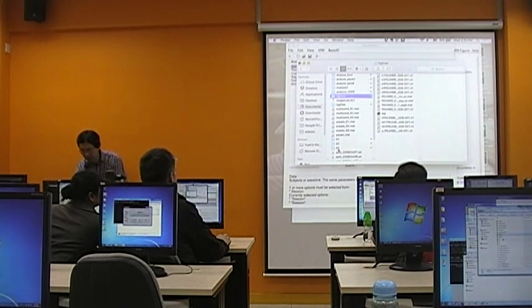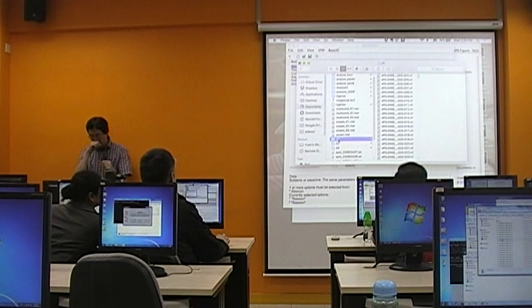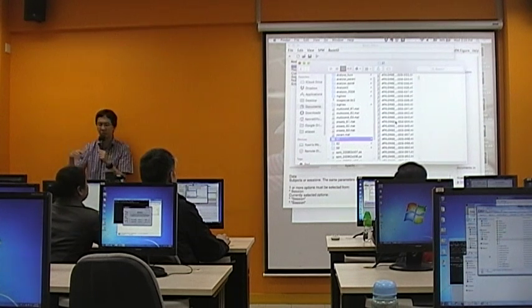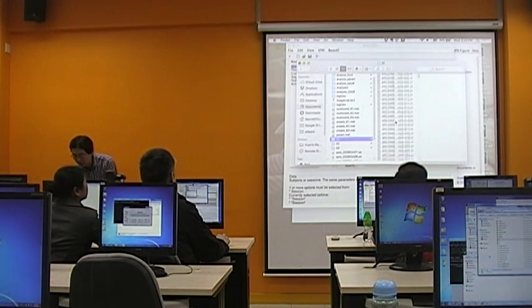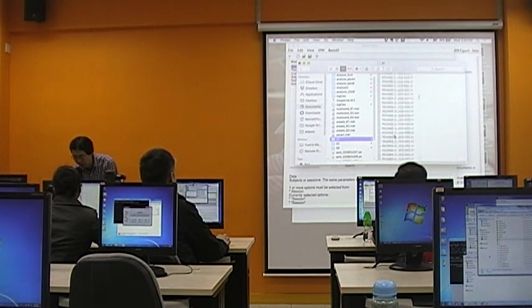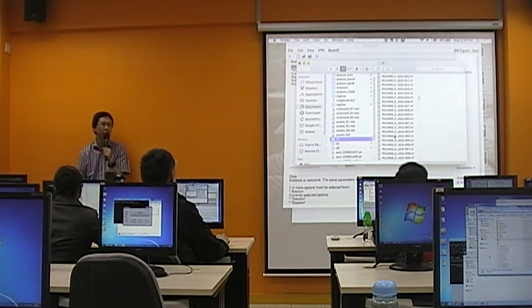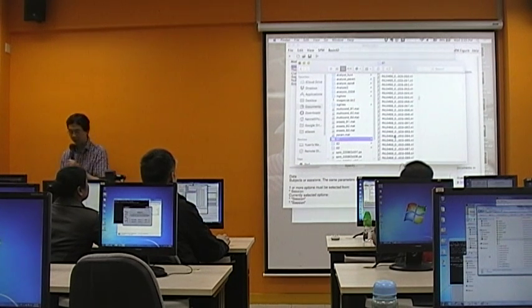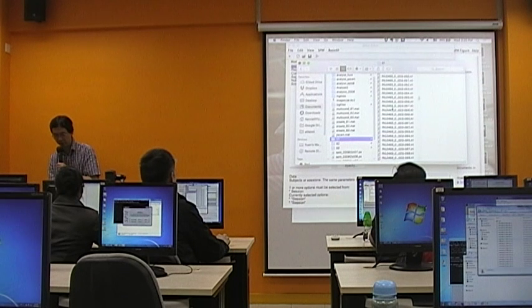Okay? Within each folder, after running the pre-processing, you should find files beginning with F and L, which is the raw data, already converted from DICOM, and which is now in a format we call NIfTI.